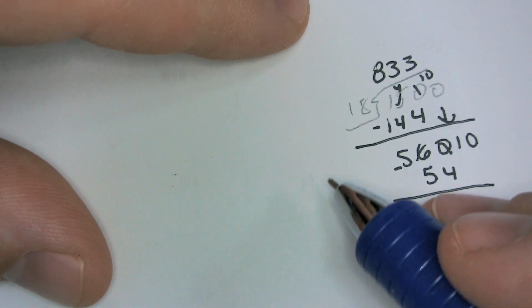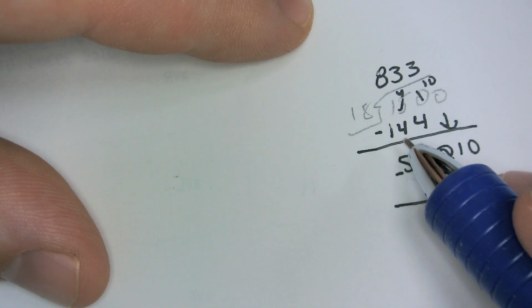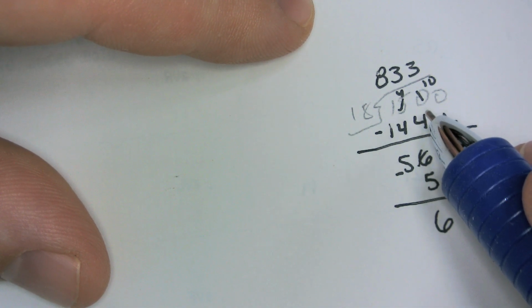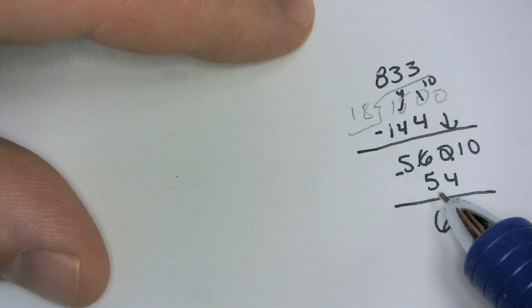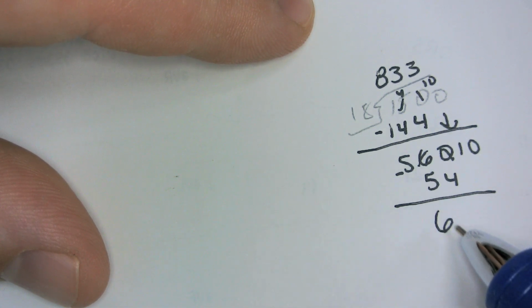And now she's going to calculate the heart rate, and shows she took 1,500 and divided that by 18. So 8 times 18 is 144. Check. Okay, so I see what she's doing right here. She's just manually working the math.